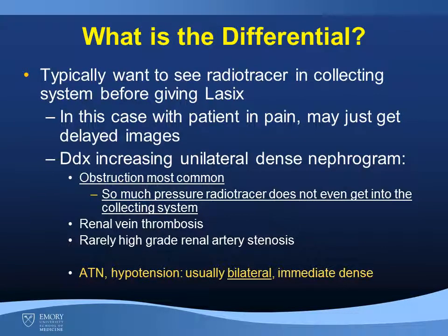First, one wants to typically see radiotracer in the collecting system before giving Lasix. And in this case, with the patient in pain, we may just want to get delayed images, and that's what we did here. But what is the differential diagnosis of an increasing unilateral dense nephrogram?